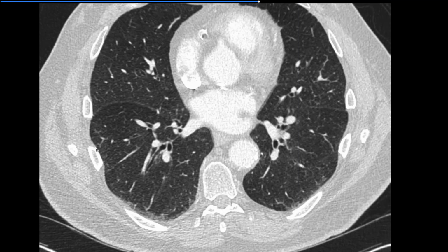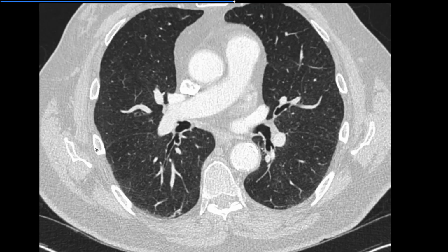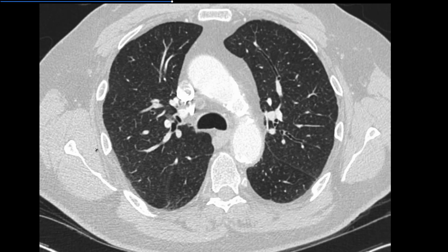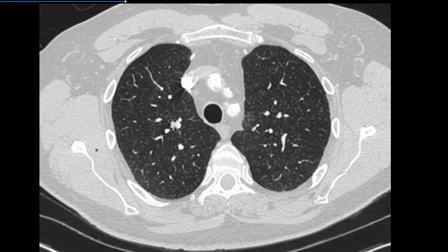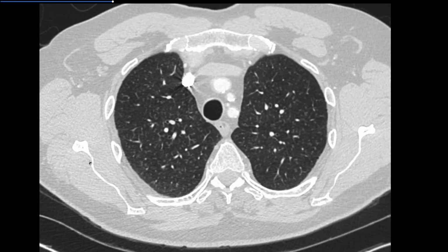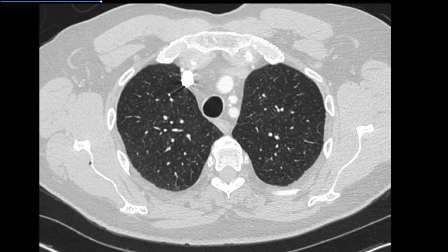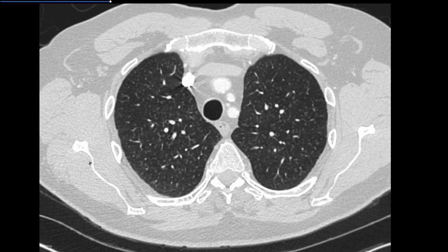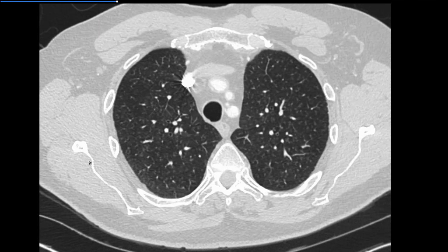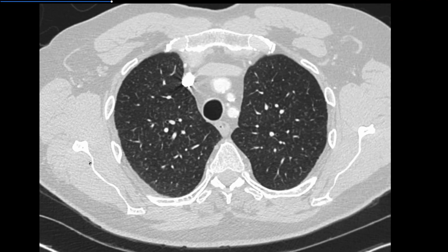Perhaps you'll agree that they seem to be very numerous in the upper lung zones rather than the lower lung zones. And there was nothing in the clinical history to suggest the possibility of hypersensitivity pneumonitis, but a strong smoking history. So because of that and the appearance, I reported this as likely a case of florid smoker's macrophages, as in florid respiratory bronchiolitis with the centrilobular nodules of it.